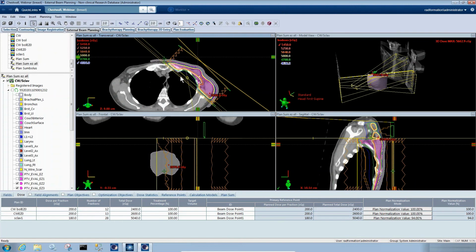Now, a lot of people ask, well, why can't I just take my EZFluence plan without bolus, add the bolus, and recalculate? You absolutely can, but you're not going to get the best optimized plan when you do that. You're going to want to rerun EZFluence with the bolus because you're going to have an overall great plan utilizing both plans that went through EZFluence, because EZFluence is going to take into consideration that extra tissue, whether it be half CM or full bolus, when optimizing.